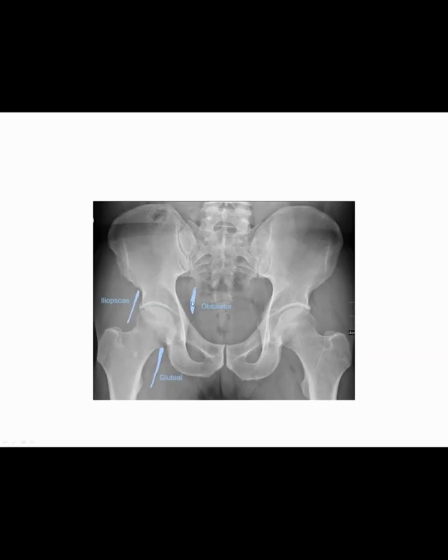And over here we have the obturator fat pad, so displacement or bulging of this fat pad can actually indicate a pelvic sidewall hematoma secondary to a fracture. So if you could imagine if there was a pelvic fracture and we have a hematoma forming against the pelvic sidewall here, that density is going to push this fat pad over to the side and cause it to bulge.